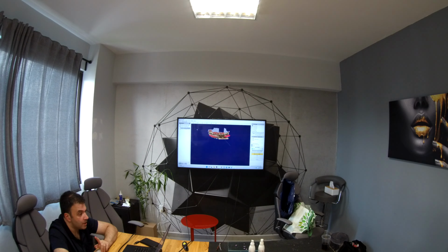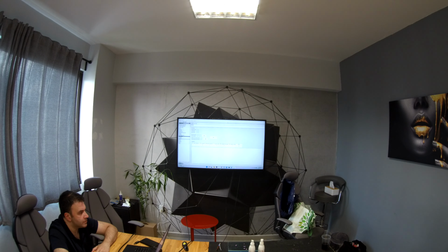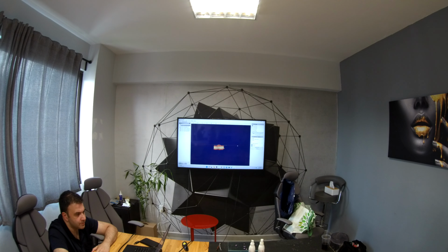Oh, no, okay. All right, but I know from whom this is. So exit, I don't want to. So individual models. Model alignment on the bite fork.